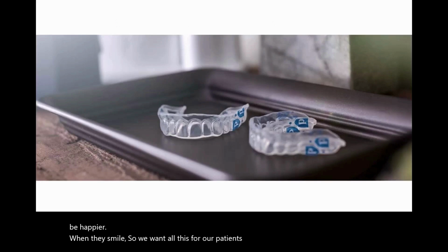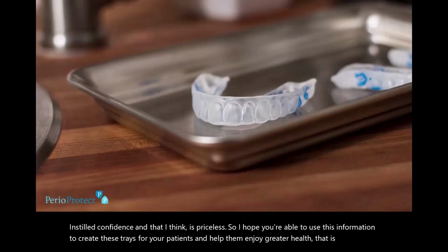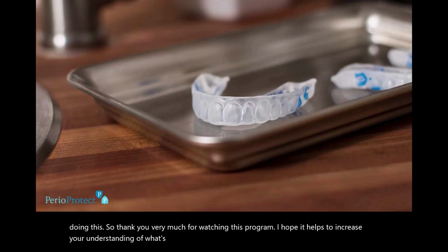So the Perio Protect trays are a way that we can offer our patients a minimally invasive procedure to improve their oral health. So thank you very much for watching this program. I hope it helps to increase your understanding of what's required to get good fitting trays back from the laboratory.